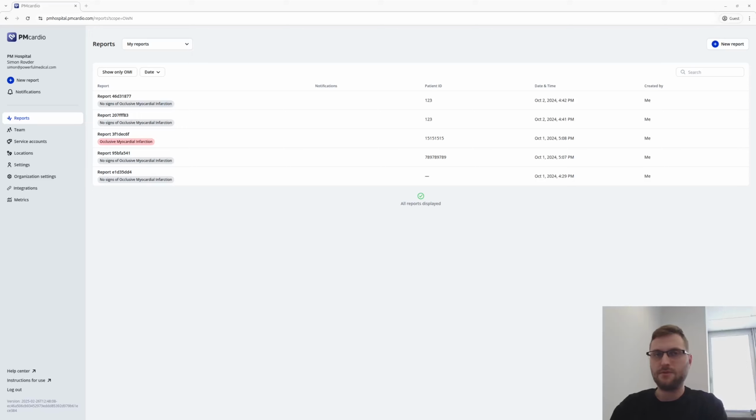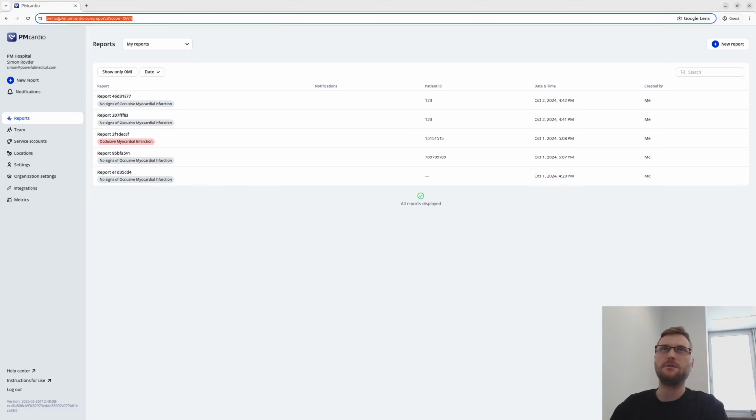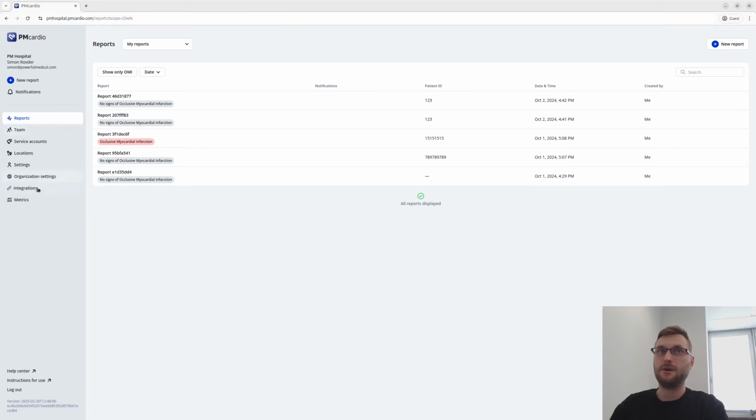Hello, welcome to the tutorial video that explains how to set up integrations with hospital systems on the PMcardio for Organizations platform. In front of me, I have the platform open. I am logged into the PM Hospital tenant, Medical Hospital, so you have the domain pmhospital.pmcardio.com. I also have super admin permissions. These are the permissions you need in order to set up integrations.